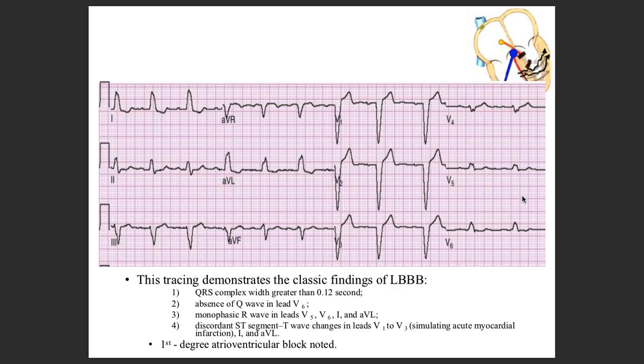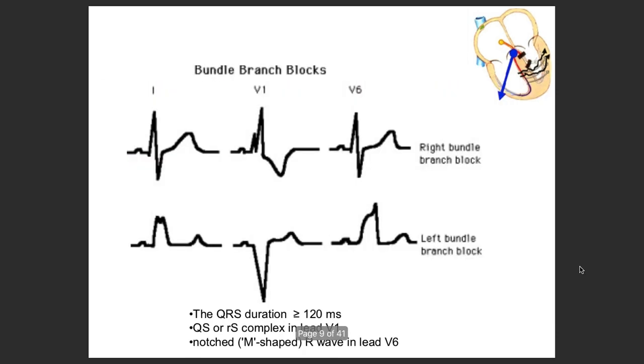And in aVL, for example, the T wave and the ST segment as well, there's depression, isn't it? So there's a T wave inversion. If there is any confusion about any point, let me know.